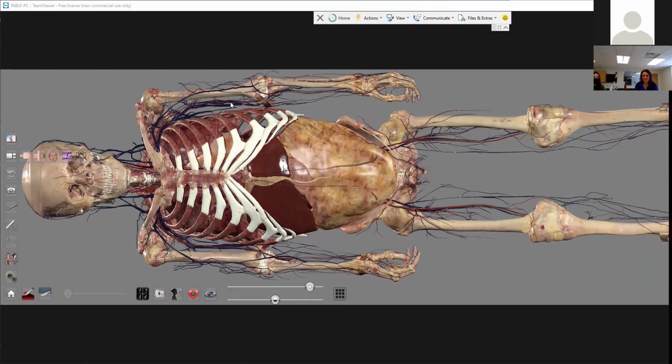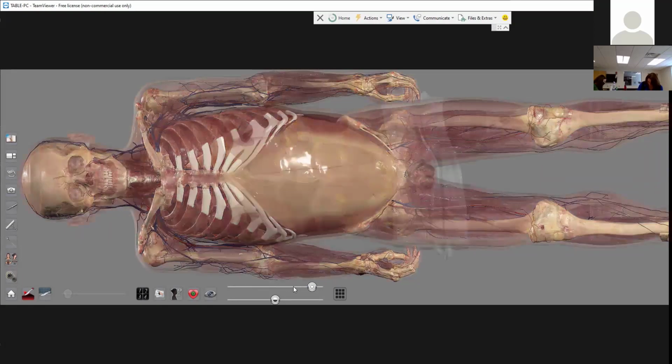So we just went through the layout menu, correct? What else do we got? A lot of helpful information is in the tool right above the layout menu, which is the Learning Assistant tool. Learning Assistant just provides a bunch of extra helpful information about any structure on the table.